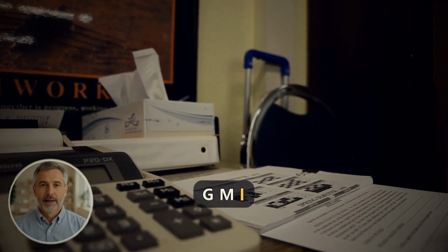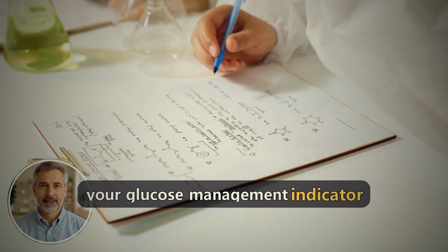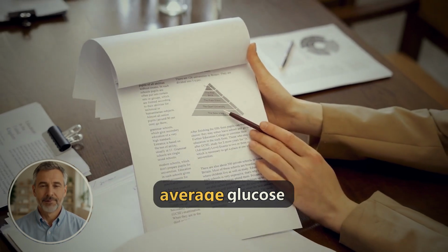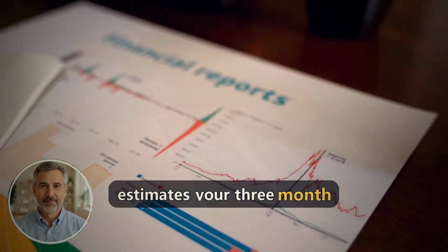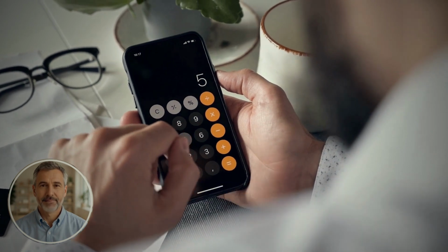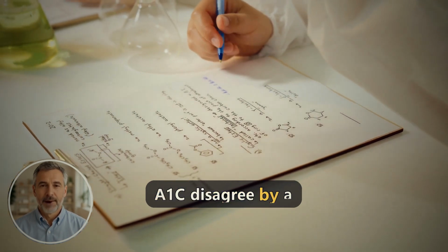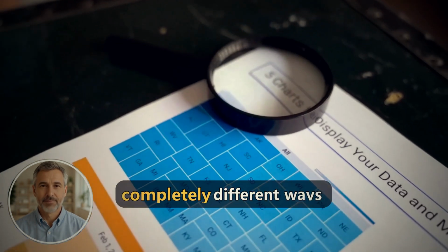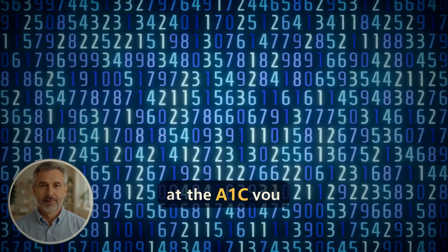Next label, GMI. This one sounds technical, and it is actually simple. GMI is your glucose management indicator, and it is basically an estimated A1C, calculated from your sensor's average glucose. Remember, a real A1C is a blood test that estimates your 3-month average. GMI does the same kind of estimate, but from all that sensor data instead. Here is the useful part. If your GMI and your lab A1C disagree by a fair bit, that is not an error, it is a clue worth mentioning, because the two are measured in completely different ways. Think of GMI as your sensor's best guess at the A1C you are building.